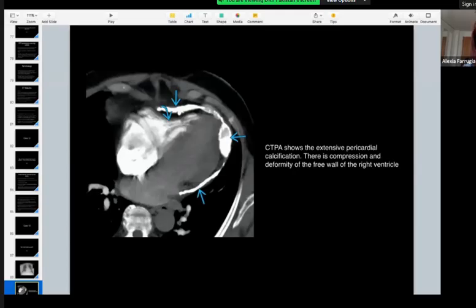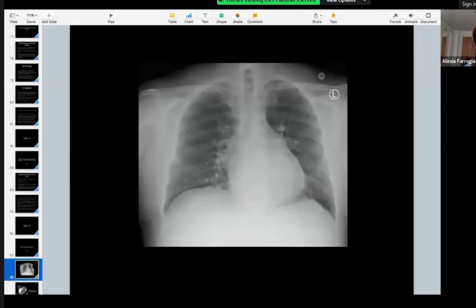The only thing I would comment about is that when you first started presenting the chest in a patient with post-MI dyspnea, you said post-MI, that showed me, if I was an examiner, that you listened to the history. So that's good.